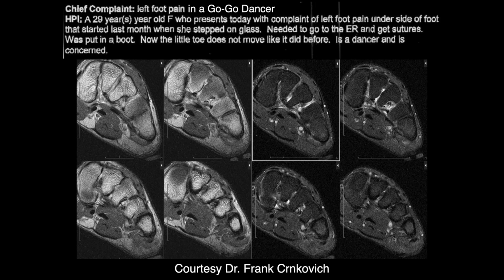So this is actually a go-go dancer with pain in the left foot. A 29-year-old female, pain in the left foot. Stepped on glass. So there seems to be some abnormal increased signal right where the skin marker is, deep to it, along the fifth metatarsal, right there. I think this might be torn. It looks like it's partially torn, right there.